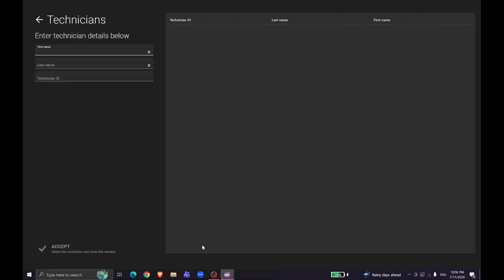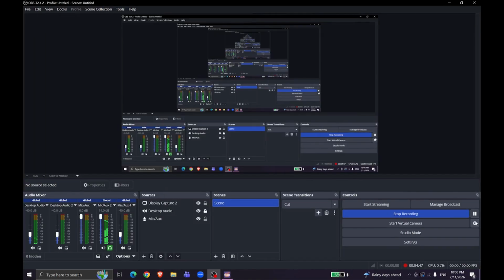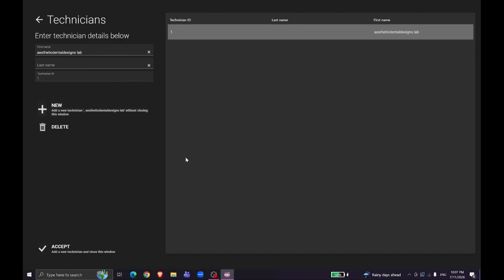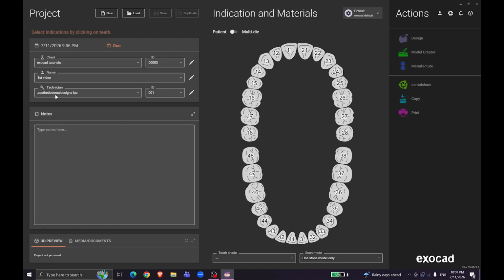Give me 1 second. Alright. You can add last name, technician ID. That's just unnecessary. Alright, we have one aesthetic dental designs lab.